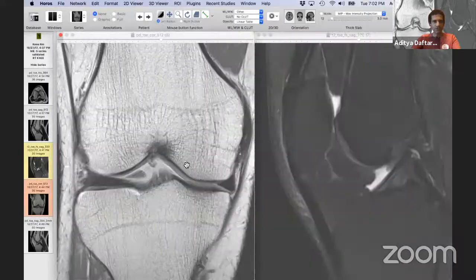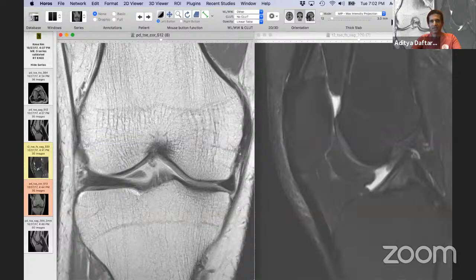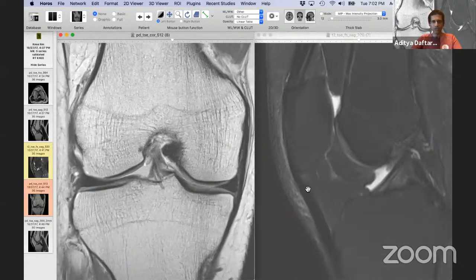So I'm going to go ahead and share my screen. First you will see Sajeer's face. No, first you will see an MRI of the knee. Hopefully most of you know what this looks like.